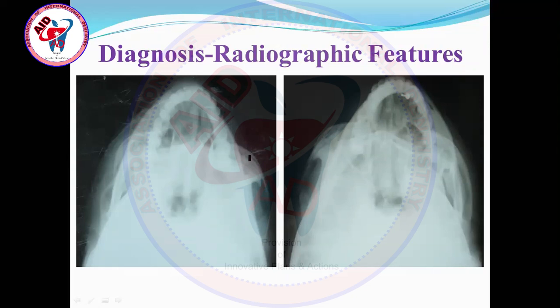And when you visualize this from below on this radiograph, this arch is in the shape of a jug handle. That's why it's also labeled as the jug handle view. And here is the triple fracture on the right side, in the right-sided picture, where I'm moving this cursor.